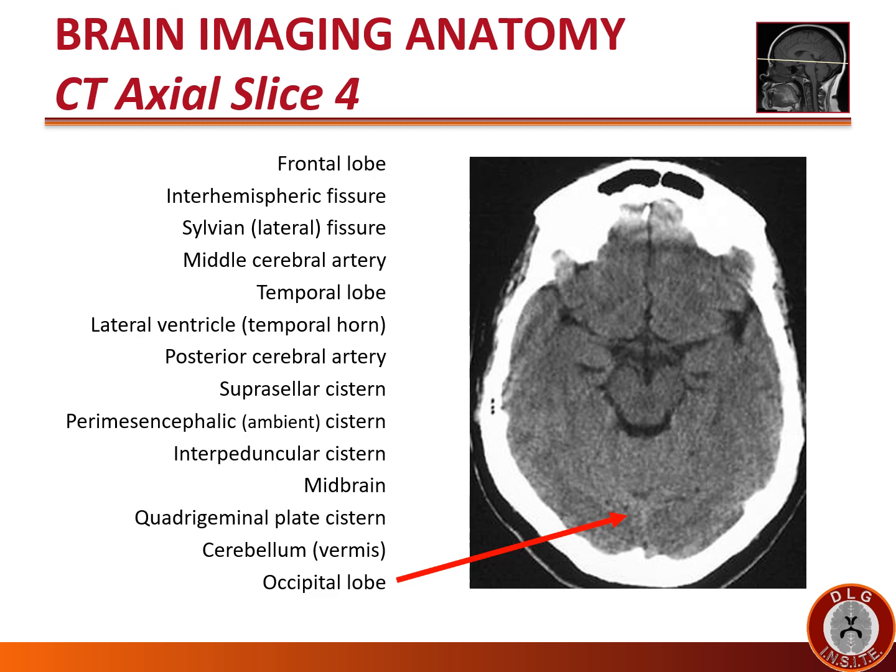Note the appearance of a wine goblet. If you look at this carefully, the vermis is the top of the wine goblet and the stem is the dura beneath it. When you see this structure, you know that the wine goblet, the center, the glass of the wine goblet, is actually the vermis, and behind it, where there's a stem, there's occipital lobe behind the cerebellum at this level.